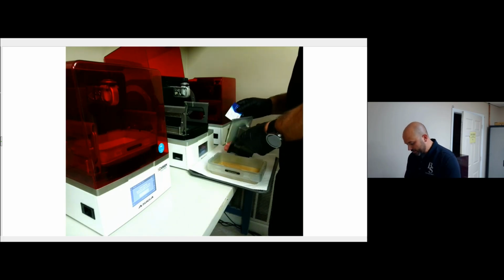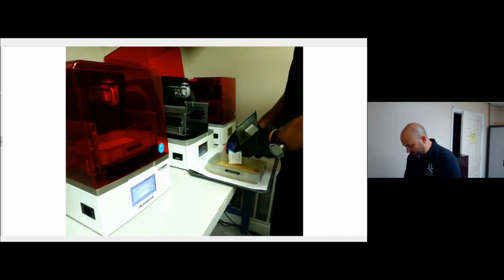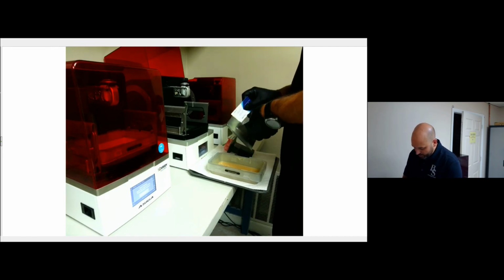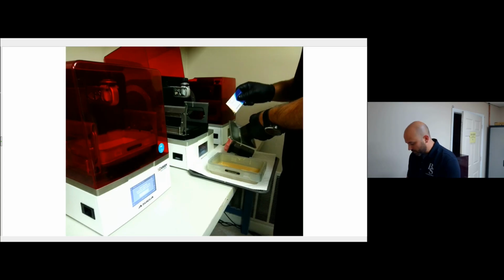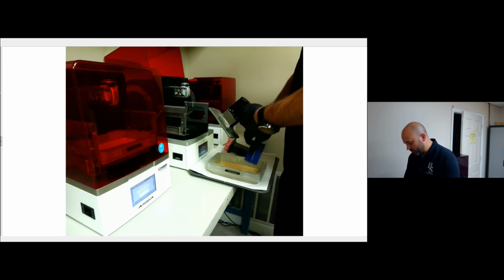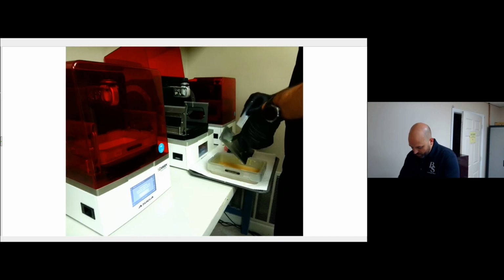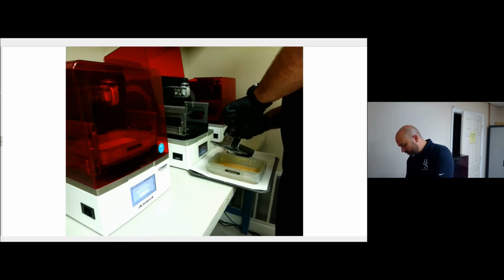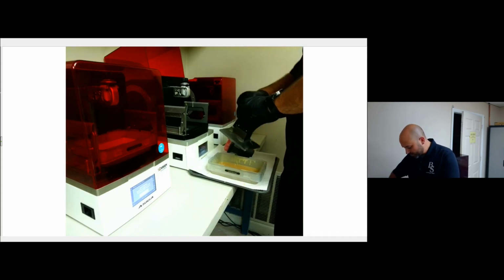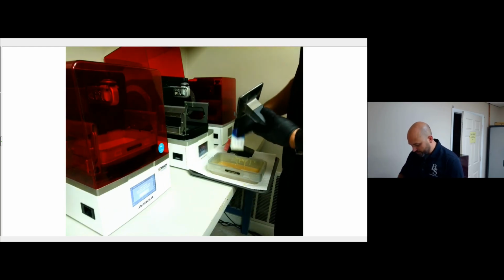This is also why I like to cluster my teeth in one spot, so that I can get a lot of this excess resin back into the tray, because this tooth material is typically the most expensive part. If I waste any of this, it's going to cost quite a bit more. So all I'm doing is scraping it off the build platform and letting it fall back into the resin tray until I get, for the most part, most of it off of here.